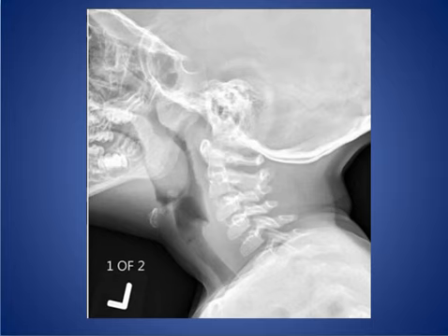The next case, this is a 4-year-old child with sore throat. As we see here in the lateral neck X-ray, we see a large adenoid with some airway compression, and very large palatine tonsils also with airway compression in the oropharynx.